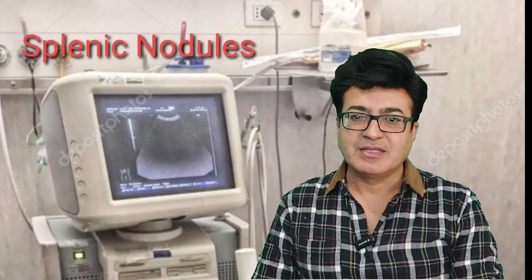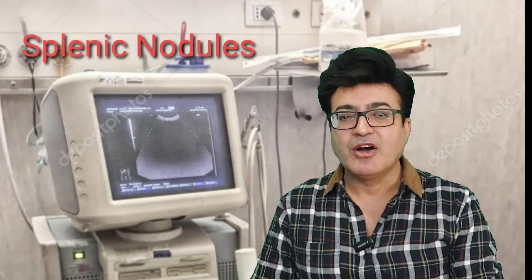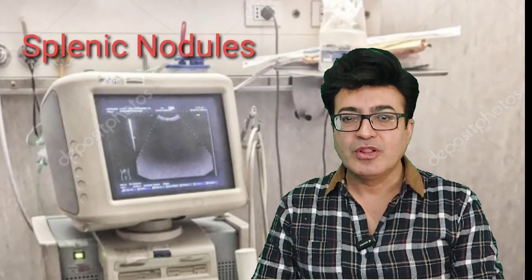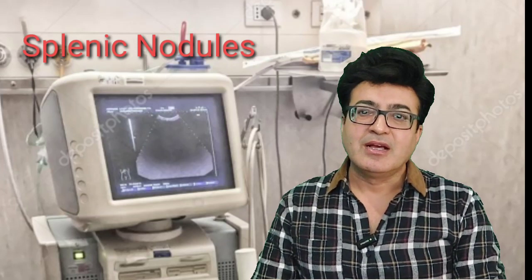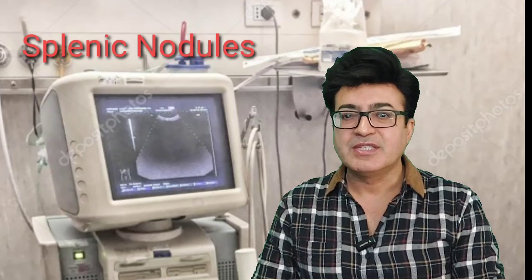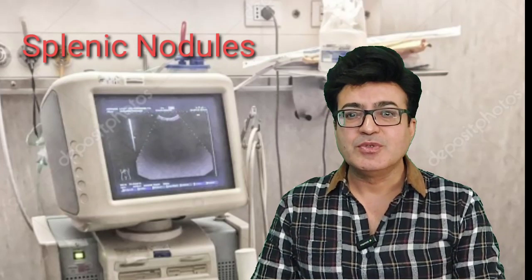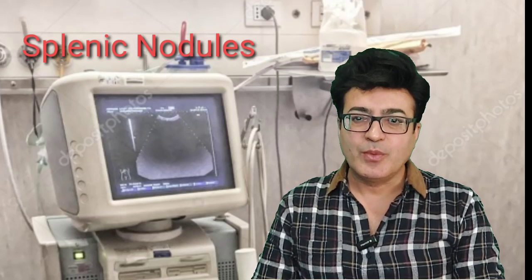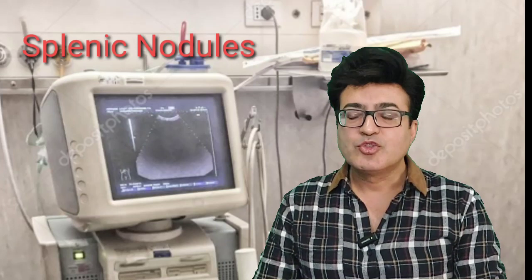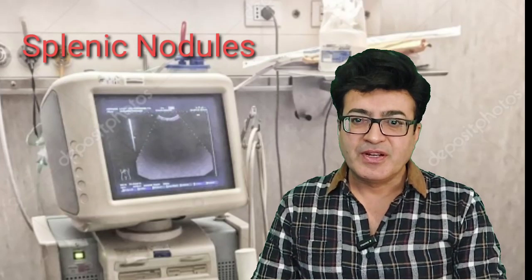There are multiple causes of splenic nodules. If the case is already known, like there is lymphoma or tuberculosis or sarcoidosis, and the patient has a history of these three diseases, and you can see nodules on the spleen, it would definitely be due to these diseases. It could be secondary to tuberculosis, lymphoma, or sarcoidosis. But if the history is not available, then you have a wide variety of differentials. So keeping the history of the patient and other complaints in view, you can suggest different diagnoses.